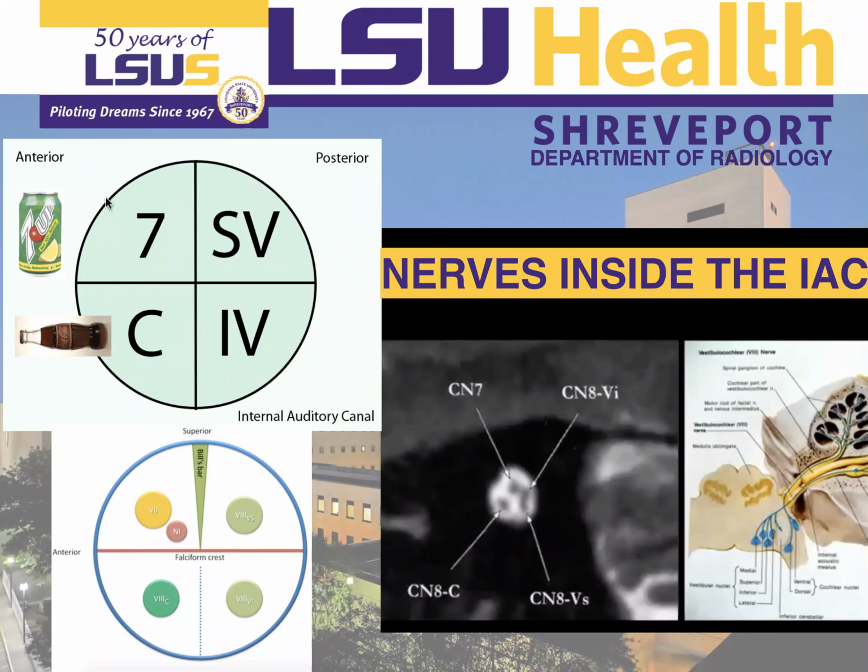Anterior portion of the internal auditory canal, you're going to see 7-Up, Coke down. And in the back, hidden, you're going to see the vestibular nerves, superior and inferior portions. Here you can see the facial nerve, 7-Up, the cochlear nerve, Coke down, and the vestibular nerves on its posterior part.